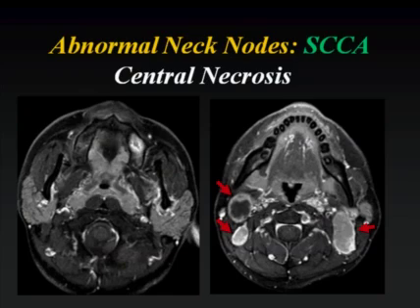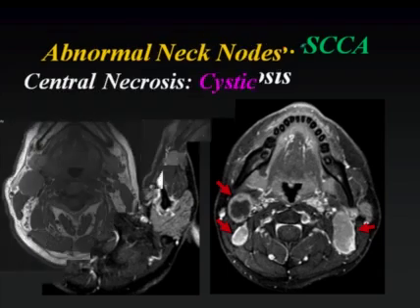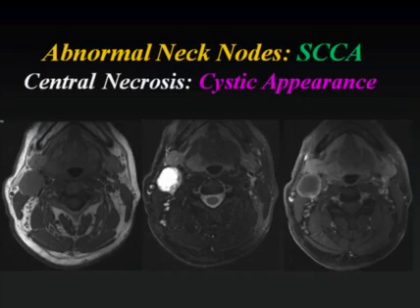Now, when we're referred patients with head and neck cancers, particularly when it's squamous cell carcinoma, often these nodes have a striking degree of central necrosis. And here, head and neck gadolinium MRI, notice that on the right, one of them is homogeneously enhancing, but the more anterior node has extensive cystic change. So with squamous cell carcinoma, because of the cystic appearance, and here's just another example on now a T2-weighted sequence with fat suppression, how cystic these nodes can be because of the extensive central necrosis.